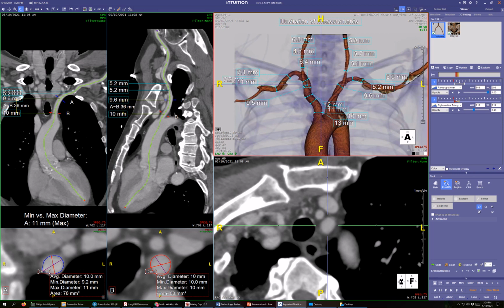So this one is the axillary. Distally, these are the subclavians. Those are the other subclavians. And this is the innominate. So for the subclavians, it's proximal, mid, and distal, and that's axillary. So let's see what a picture of this looks like.